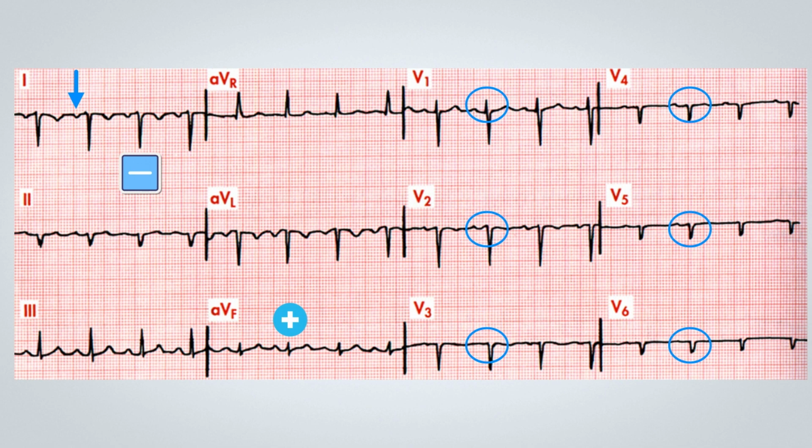So what I'd like to draw your attention to is the negative QRS complex in D1, negative in AVL, positive in AVR, and positive in AVF. If I look at this, I might think, gosh, could there have been a cable swap? But when I examine the precordial leads, I see that the R wave from V1 to V6 is also decreasing instead of progressing. We then associate this with the clinical picture.